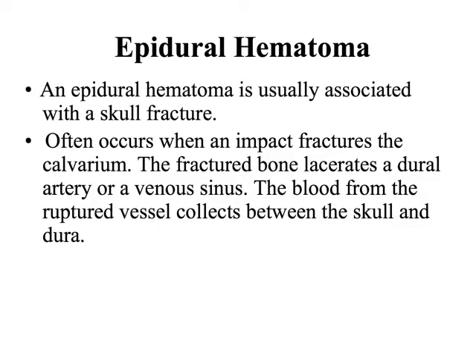So an epidural hematoma, and these are normally associated with some kind of skull fracture. So if we identify one of these, we're going to be looking at the bone windows as well to see if there's a fracture nearby. And it's going to occur with an impact fracture to the calvarium. So the fractured bone lacerates the dural artery or venous sinus, and the blood from the ruptured vessel collects between the skull and the dura mater.